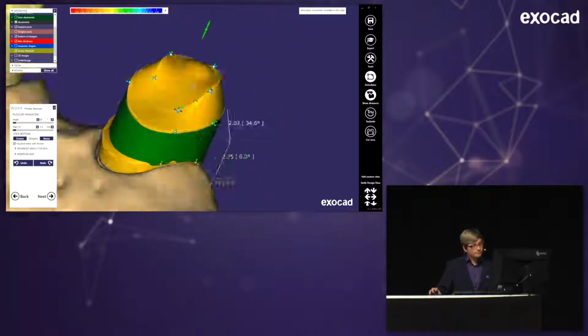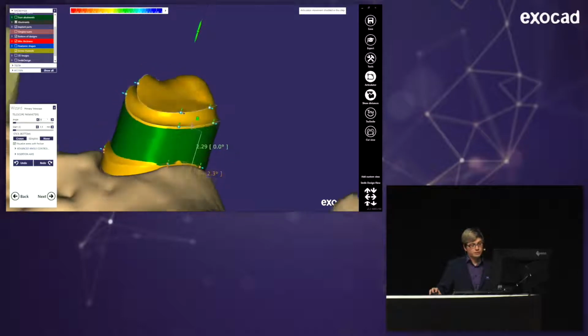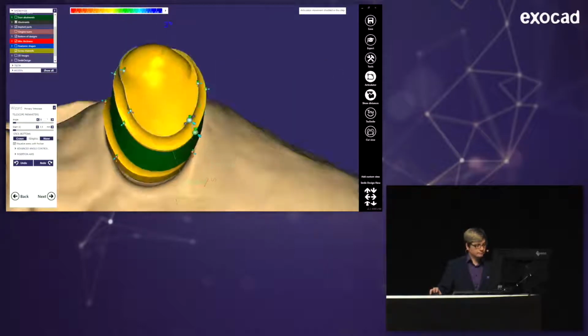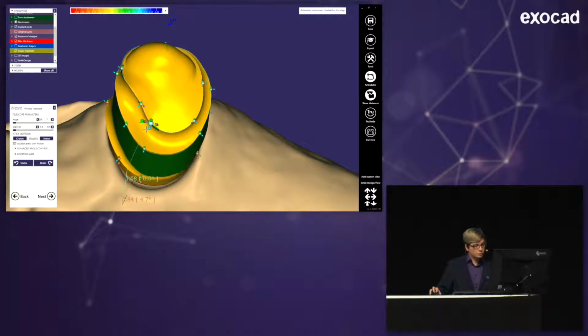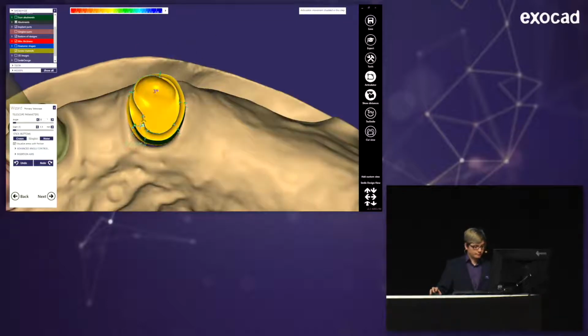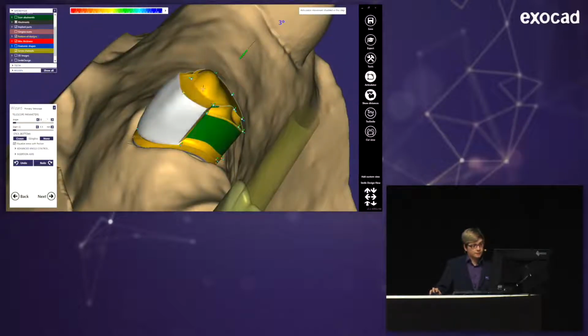And now, again, I pull those points outward, downward, upward, inward, and switch it to parallel, and I have my shoulder. Here a little bit more space. Maybe add another point to correct this. And now again, I'm changing the vestibular part to anatomical shapes.